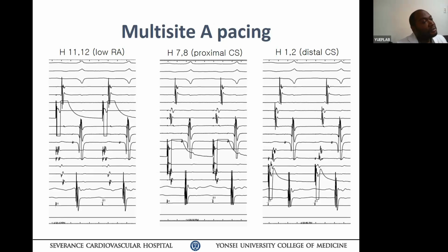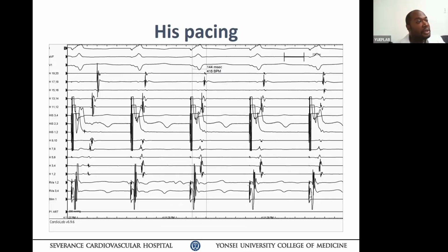However, we cannot explain the change in delta wave morphology. Usually the delta wave is fixed in fasciculoventricular. That was the issue. We can see much more augmentation of the delta wave during higher rates, during His pacing, and S2.